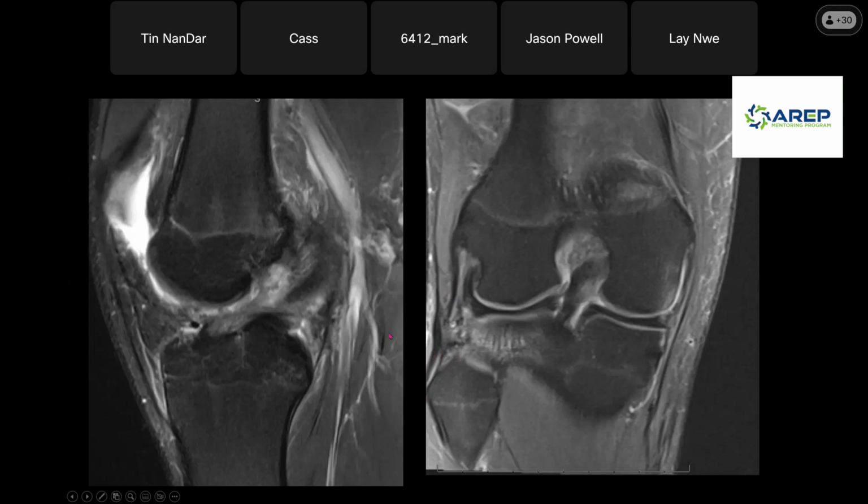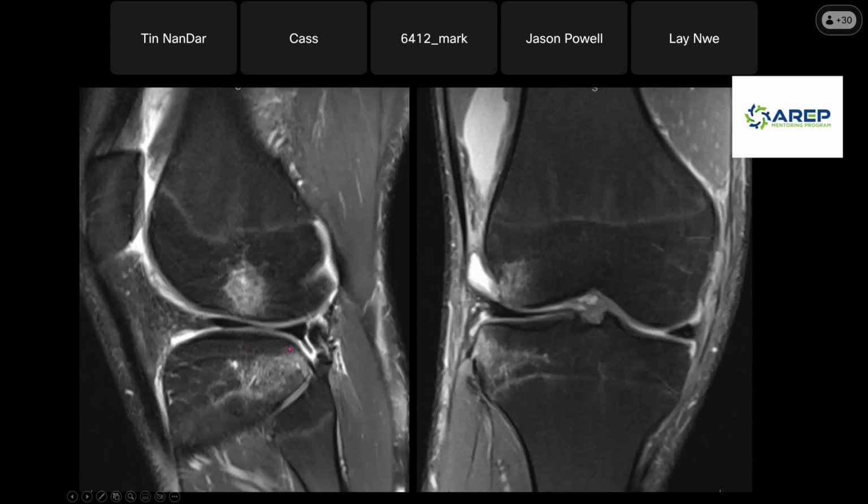So in a pivot shift injury, what happens is the ACL, because of the way that it's wrapped around the PCL, when the knee joint turns and this posterior aspect of the tibia twists forward and hits this aspect of the femur, causing these contusions that we see commonly on pivot shift injuries. Because of that rotation and the way that the ACL is oriented around the PCL, it gets stressed and torn, and then those lateral collateral structures get stressed. And that's with a pivot shift injury.